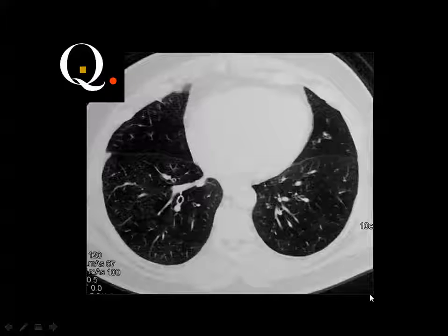Then look at this CT scan of the chest, high resolution scan, and you can see the site of the fissure, which is almost corresponding to the line I draw through the thoracic cavity, dividing the thorax into anterior 1/3 and posterior 2/3. Then if I asked you about this area, you will say that this is the medial segment of the middle lobe.